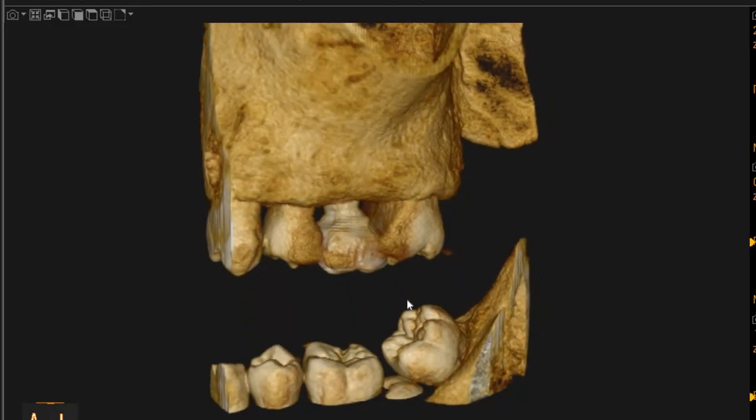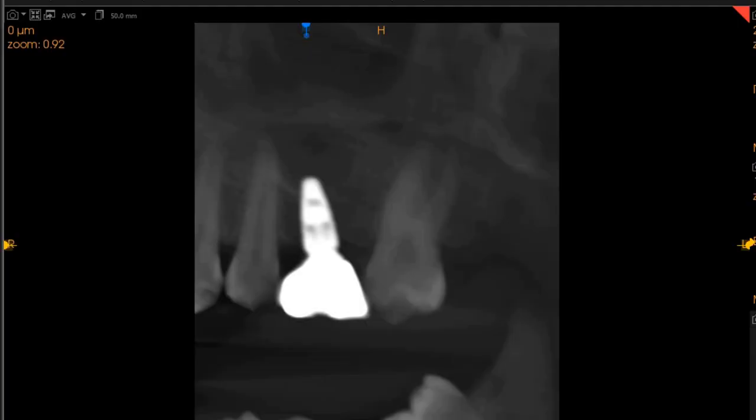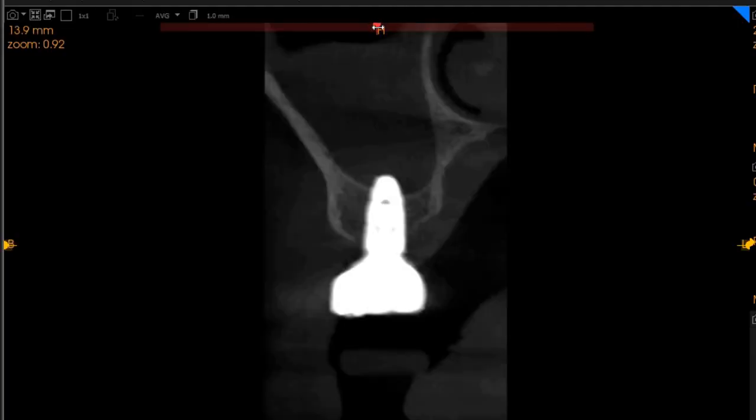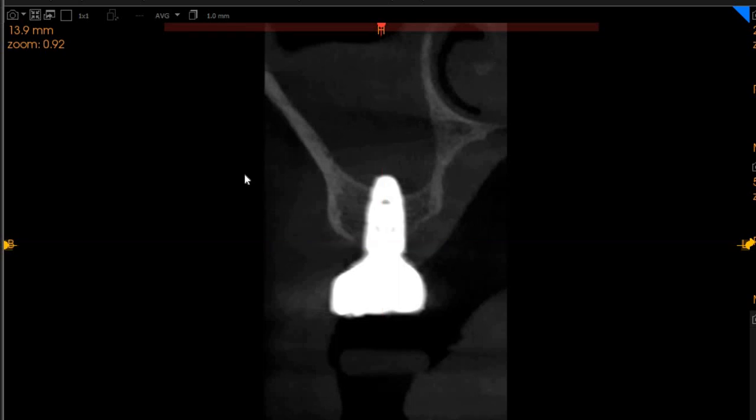This is part 2. So this is the upper left segment endodontic mode. This is the sagittal view. This is the transaxial view. So here you can see implant placed very well, center of the ridge, partly into the sinus. There is immense sinusitis that we can see here.